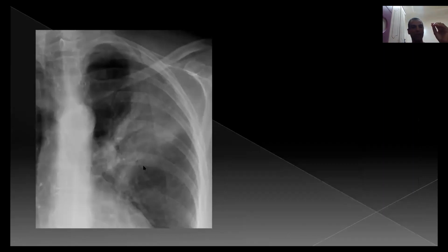Also, it's very clear to have a left upper lung lobe pneumonic patch, and I need to stop at this image for a while. You should see the air bronchogram going inside this alveolar shadow or this consolidation. What is the significance of seeing this air bronchogram? What does it mean, air bronchogram? It's the air inside the bronchial division.